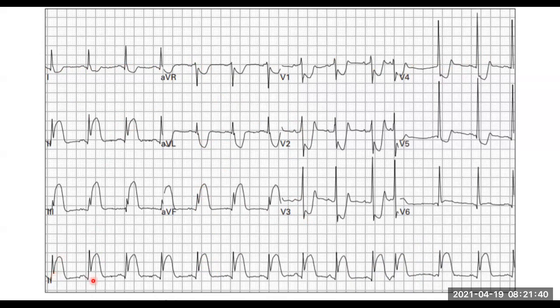And then the last question is, is there a QRS after every P? In other words, is the ventricle contracting after the atrium for the majority of the time, except for one here, all right? Otherwise, it seems to be okay. Is it regular? Actually, majority of the time, it is regular, except when you get to there's one beat in the middle of everything over here, all right?